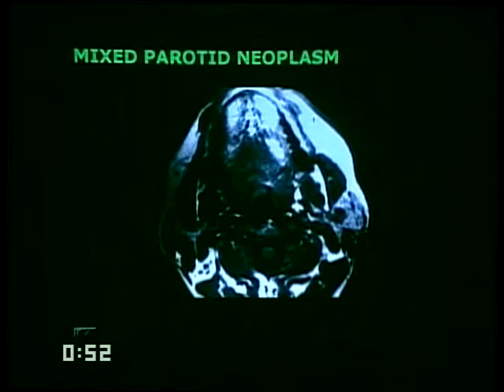Mixed parotid neoplasms or pleomorphic adenomas are the commonest tumor in the parotid space. They are solitary tumors, usually unilateral, fairly well circumscribed with variable enhancement patterns. We used to call them benign pleomorphic adenomas. We don't anymore because there is a significant chance of malignant transformation, approximately 10%. They do tend to reoccur, and when they do, they're more likely to be a higher grade or more malignant than they were before. Again, well circumscribed, intraparotid, usually unilateral, and usually solitary.